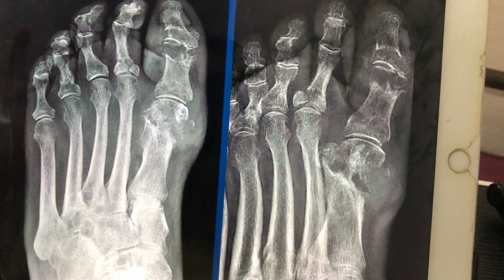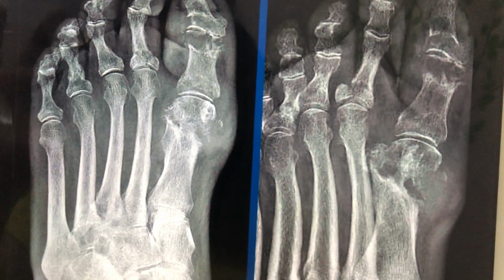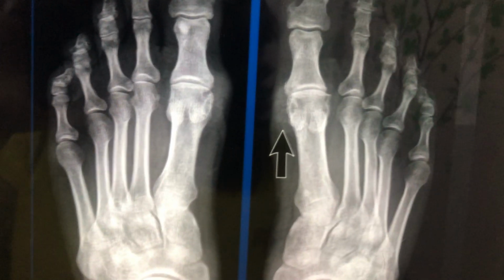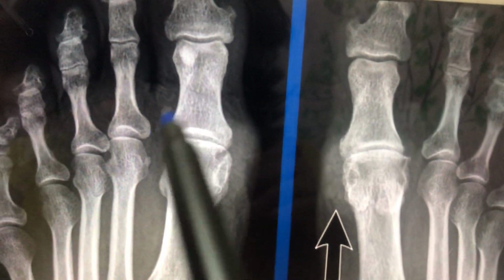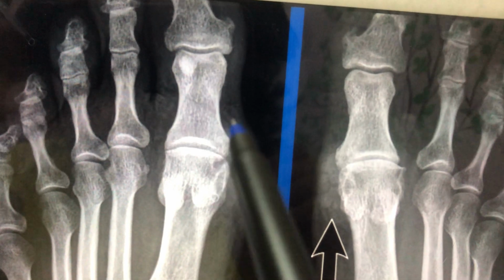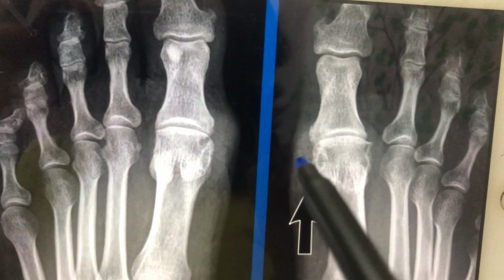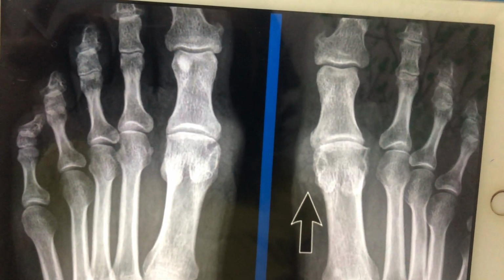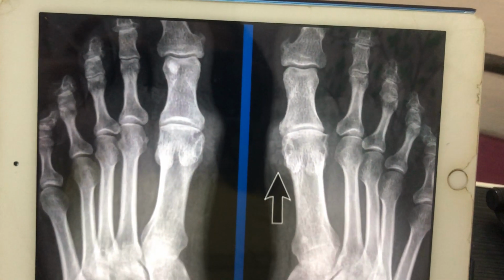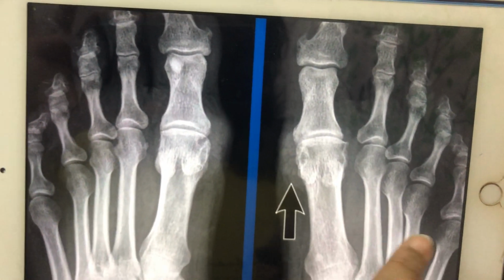In the soft tissue, very important, you have eccentric nodular calcification or nodular soft tissue swelling, and this is because of the crystal deposition, urate crystal deposition. Here you can see that there is no obvious bony erosion. The joint space is also well preserved, but in the soft tissue there is faint calcification, and this is a case of tophaceous gout. These were the deposition of the urate crystals or tophi. Apart from this, in the soft tissue you can have olecranon as well as prepatellar bursitis.